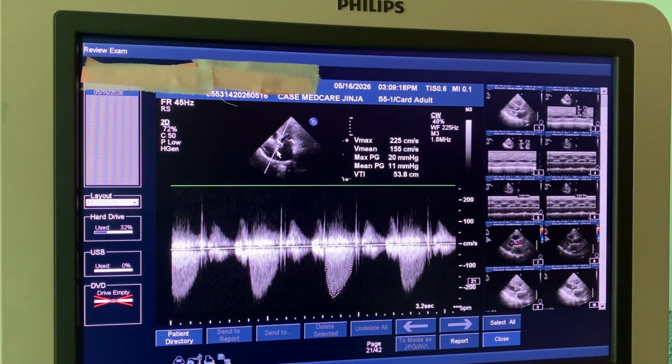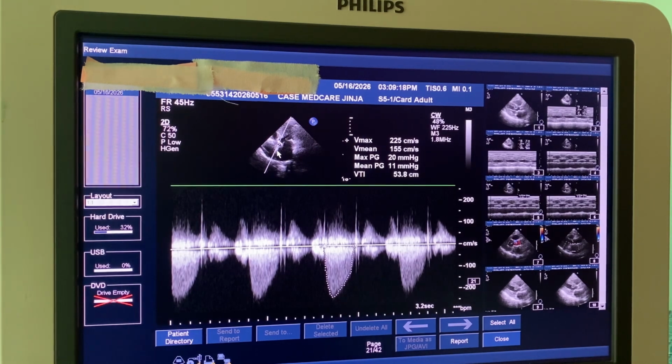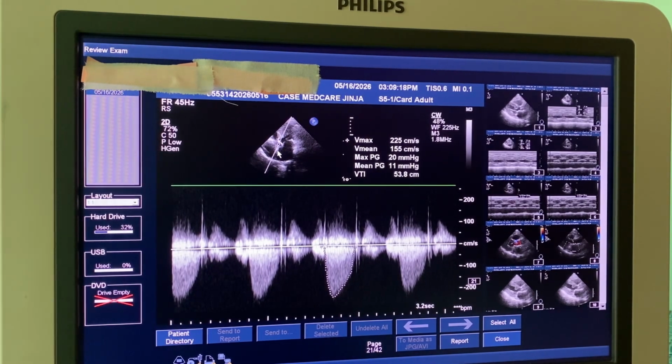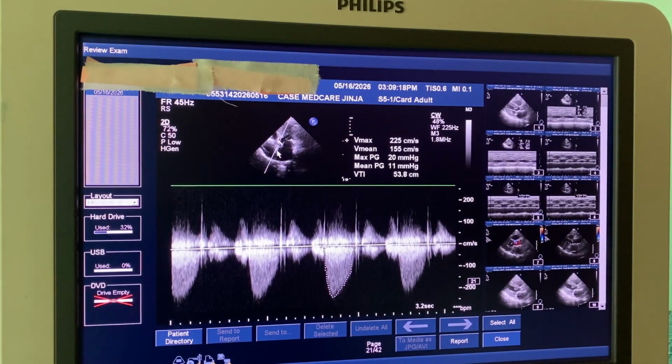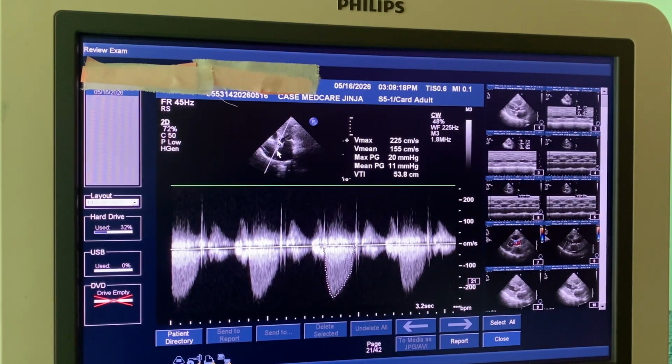Things that can make the valve not open very well. Calcifications. Yes, but if ejection fraction is less, there is no reason why the valve should open all that wide. So it may appear small because less blood is passing. There is not much blood to force it open. Yeah, but in this case, the EF was 73, meaning contractility was okay.